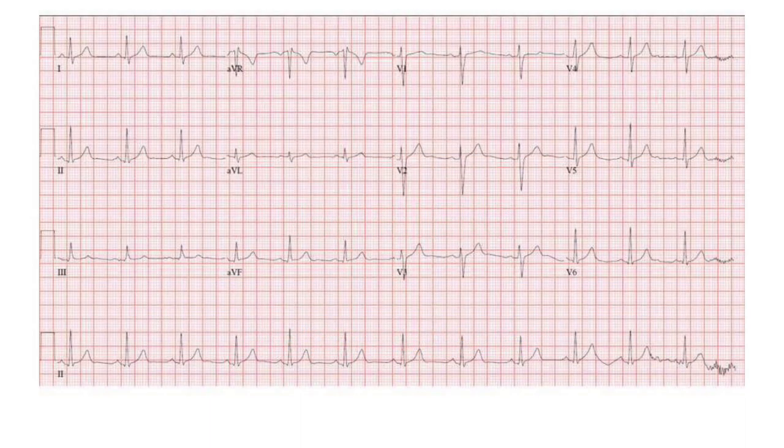Now this is your normal EKG paper. You can see that there are 12 leads on this EKG paper. We have 6 limb leads: lead 1, 2, 3, AVR, AVL and AVF. And we also have 6 chest leads from V1 through V6.